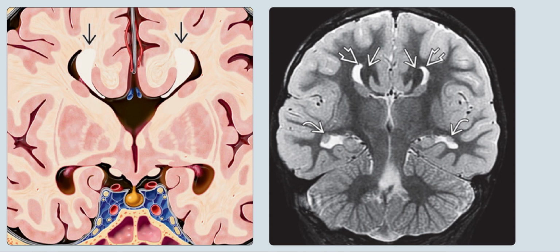The image on the right is the coronal T2-weighted sequence with callosal dysgenesis, and it shows the Viking helmet or moose head appearance of the widely separated lateral ventricles. The very hypointense white matter tracts medial to the lateral ventricles are the Probst bundles, and also note the heterotopic gray matter.